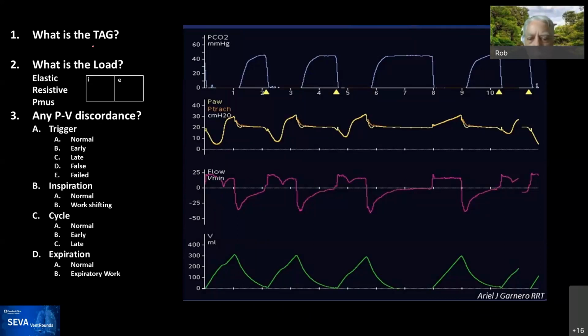I'm going to say volume control, probably CMV, because the distorted flow waveforms still look like it's trying to be volume control, but the flow is dropping. It's not constant. So I'll say volume control CMV, because I don't see any indication of anything being done automatically here. Tidal volumes are consistent. So pretty confident at volume control CMV.